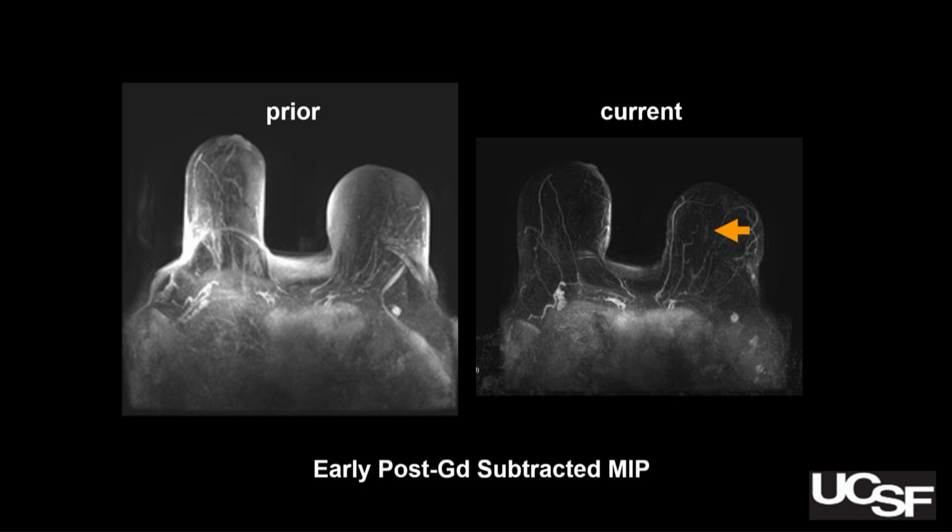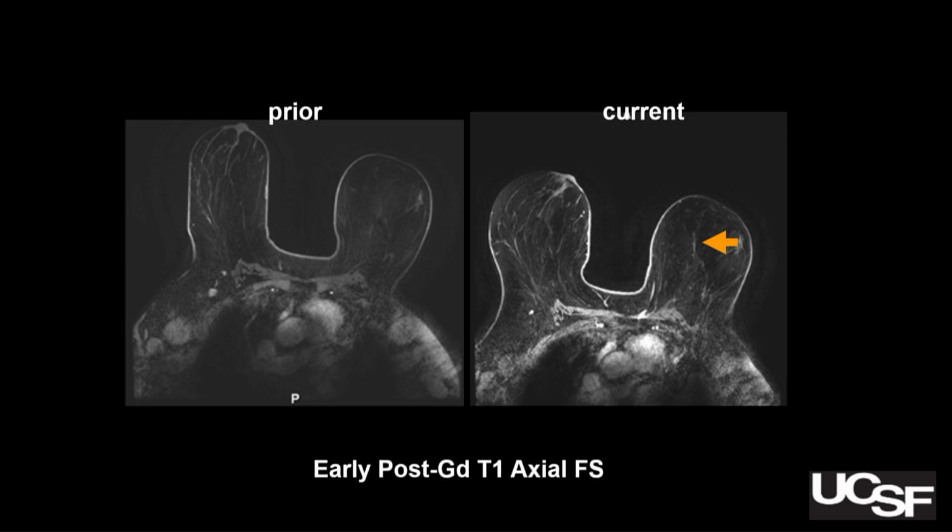So a little line going anterior posteriorly. Looks like it's new from prior. Here are some of the selected slices. I tried to match them up as much as possible, accounting for differences in positioning from year to year, but could not find it on the prior.